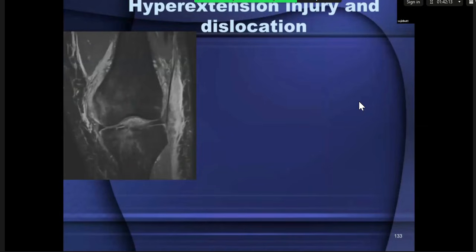In terms of MR, just be prepared to see the most horrible looking knee you would ever see. It would take you a good 5-10 minutes just to identify the structures which you can and which you can't see. So in this case, complete rupture of the medial collateral ligament should be spotted first, significant bone bruising, extrusion of the body of the medial meniscus, meniscocapsular injury, huge soft tissue hematoma present around the lateral side, soft tissue injury present between the iliotibial band and the lateral femoral condyle.